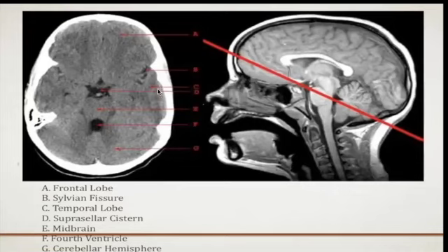C, as we look aside here, that's the temporal lobe. So that's the frontal lobe, and separated by the Sylvian fissure or the lateral sulcus, we are supposed to see here the letter C, which is the temporal lobe. Okay. And then we see this star-like structure, which looks like the Star of David with the six angles. And this star-like structure is the suprasellar cistern. Now, the suprasellar cistern is located above the sella turcica, and it's under the hypothalamus.